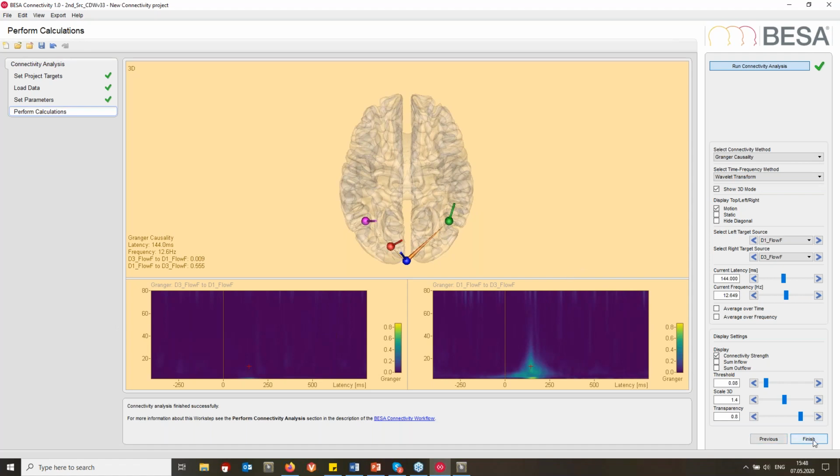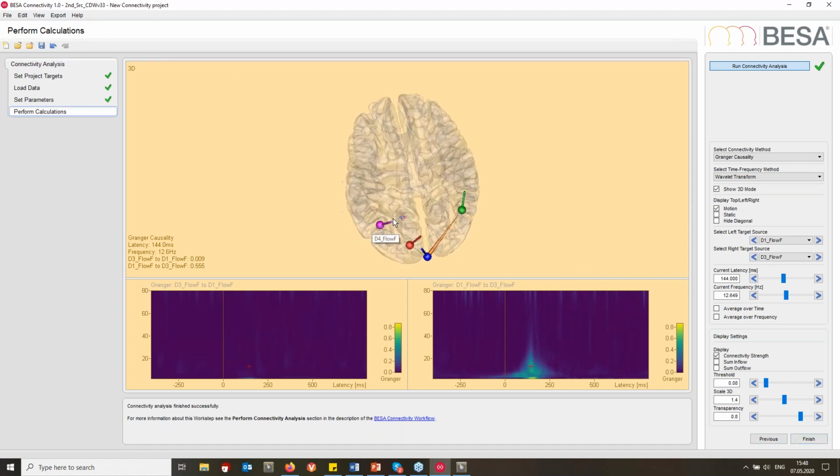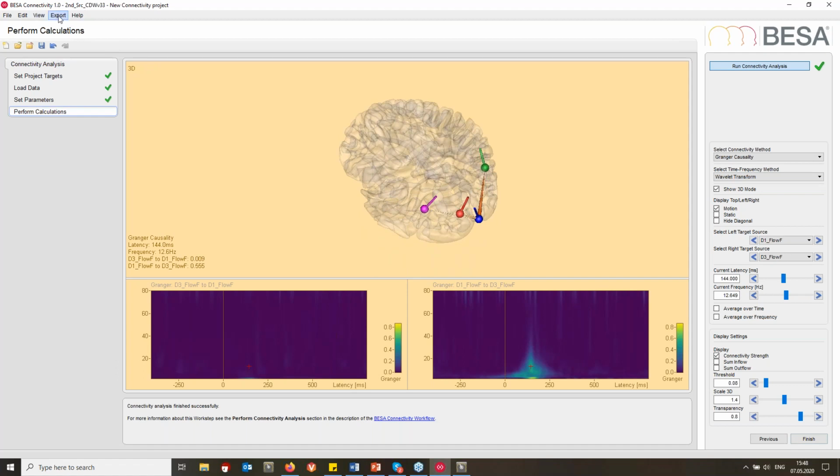Good, and yeah, then of course we can export these. There's other things we can do, for example, create videos. So yeah, we can export a video, but I think this is also part of some YouTube videos, and we're running out of time. So yeah, maybe you'll have a chance to explore it yourself. And I think the video function is very nice. Also, all the results can be exported into ASCII data and can be loaded into MATLAB for further analysis.